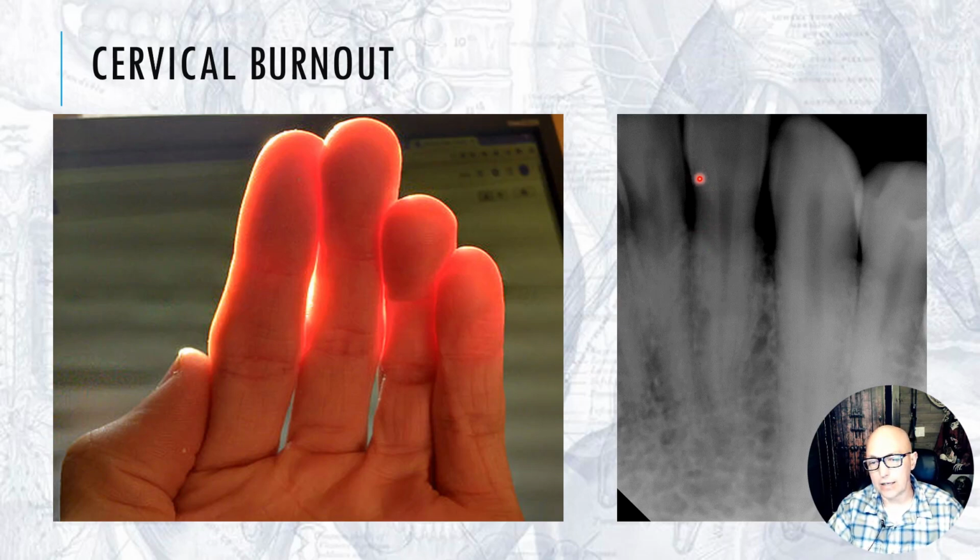The other thing that does that is you have enamel up here. Here I can see the line of enamel. If you know dental anatomy, the enamel arches up where you have the papilla, where you have the gingival outline, and then it curves down on the buccal and lingual surfaces. And so that outline of enamel creates a more dense appearance up here around the crown of the tooth, and down here what do you have? What's creating this to look more opaque? You have the bone. And so the bone level, you see curving around the root of that tooth as well. So that's something that adds to it.